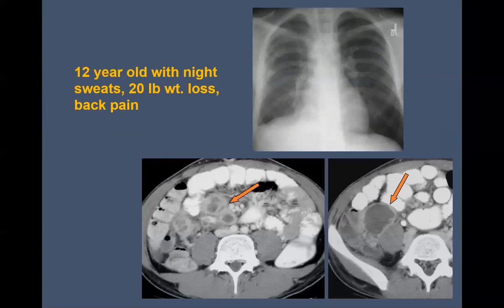So this is vascular marking. This is kind of a small image, but these are all vascular markings. I can see how you might wonder about this, but that didn't really prove to be lymphadenopathy in this particular child. Although certainly they would be entitled to some lymphadenopathy in the chest as well. But the main finding on the chest X-ray was really the pleural effusion. So at first we weren't really suspecting TB until we got the CT.